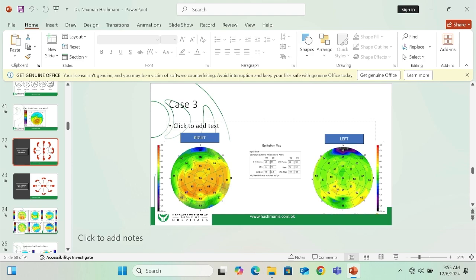And don't forget that ectatic disorders start with myopia, high myopic astigmatism, keratoconus, keratoglobus, pellucid, all in the same family. Over time, we have published this as combined corneal ectasia. The same eye will show a keratoglobus pattern, but the center will have a cone. And in a patient you followed up, the keratoconus will extend all the way to the periphery and become keratoglobus. So they're all a spectrum of disorders.